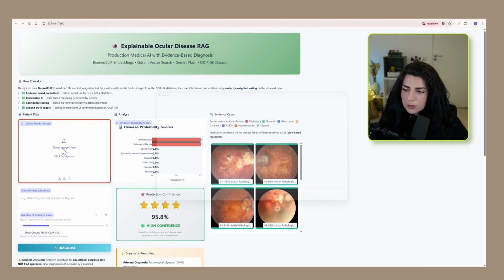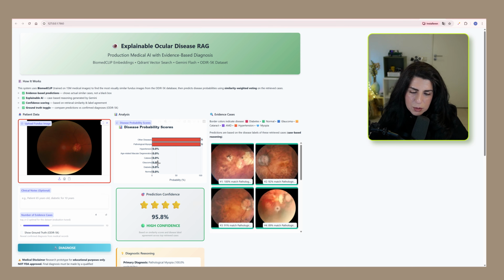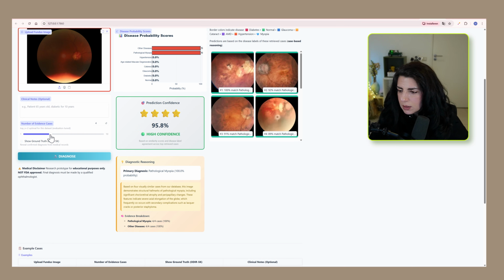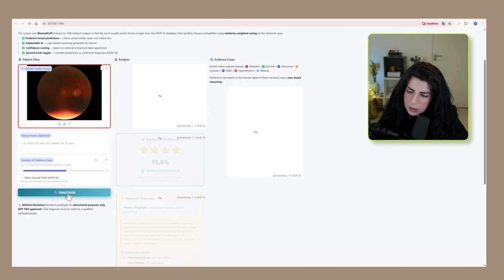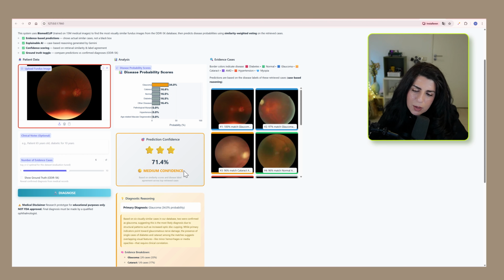We can try something completely different. Let's do this one. It's going to be a little more problematic, I think, but let me show you, if we get 6. And this looks very specific as well. You can see the confidence goes down, because it's 100% match, this is 97%, 96, and 96. But then the diseases are not matching that well.